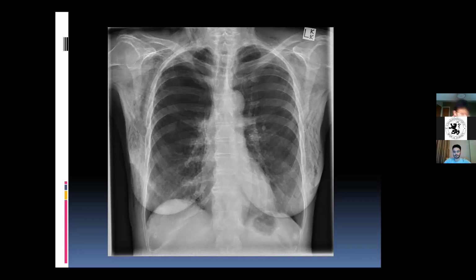Is it widespread everywhere? Yeah, it's definitely everywhere. A little bit of a background for this lady. So she is a 70-year-old and she had a radiation. Why do you think there's radiation? It could be radiation, could be that she had a neoadjuvant therapy.